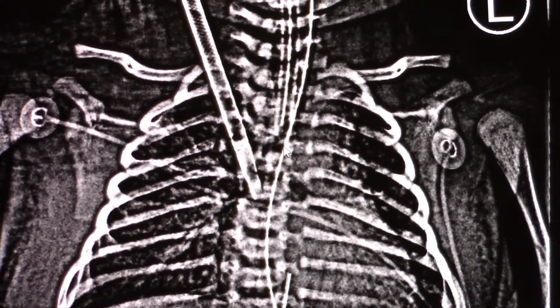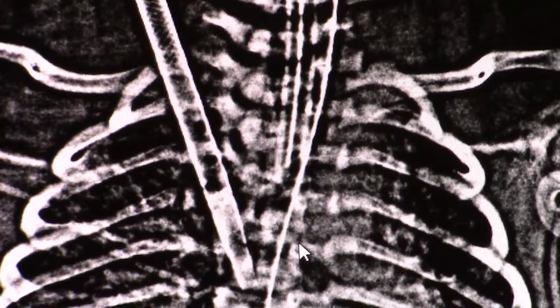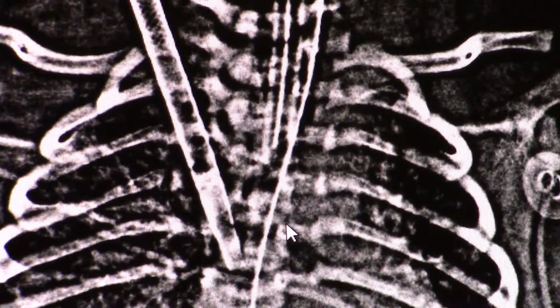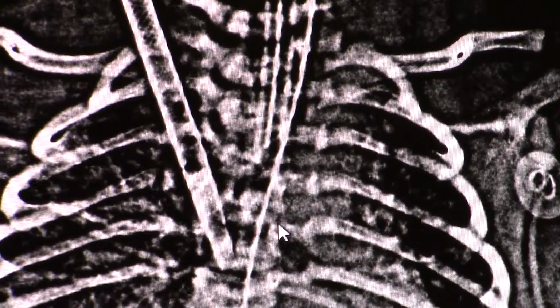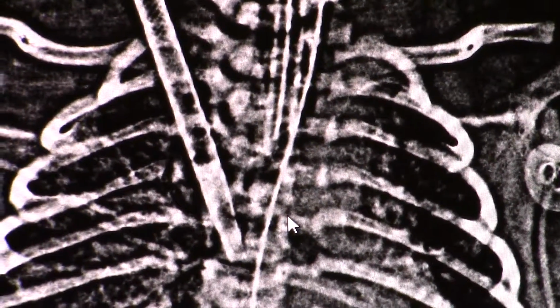Now, if you measure and it's like 1 centimeter to T4 and 3 centimeters to T1, we're not suggesting you go to the physician and say, hey, let's retape this tube and move it. We're just having you document and show that, so if they do want to move it, you'll have a really good idea of what to move it to.